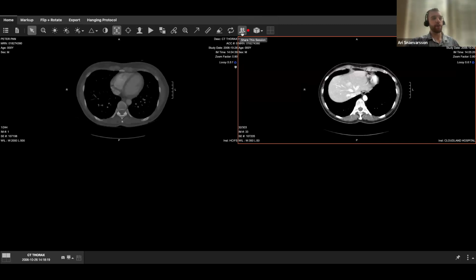We've got a feature in here called the simultaneous screen share, or a session share. And if we click this, and Les is doing the same thing now, so he's looking at the exact same screen and he hit that exact same icon. Now I see his arrow, and we should all see his arrow now. It's like I'm looking over the shoulder of my physician expert.